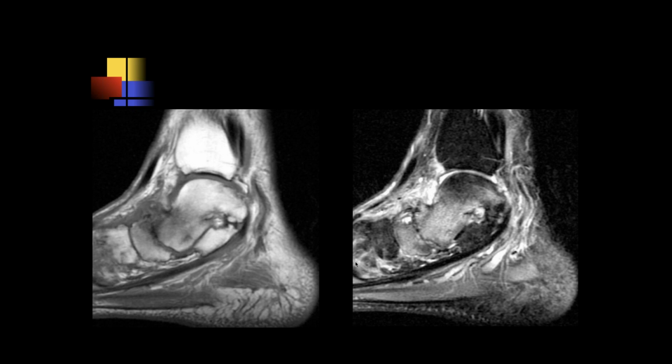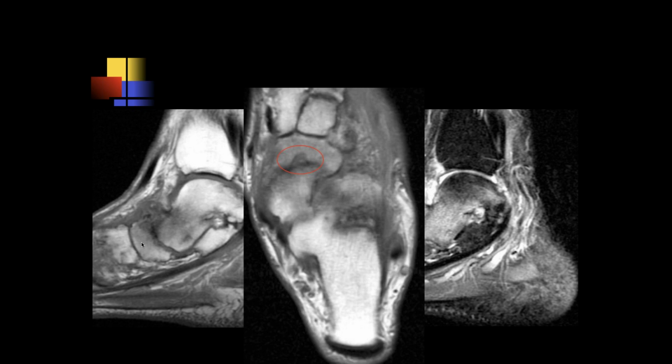It's pretty steep, which you can see in a hindfoot valgus type deformity. Yeah, it's flexed with respect to the other bones here, and there's degenerative disease of the talar-navicular joint, as you said. I would call it a little vertical. Yeah. And then, of course, you do want to look at the PTT integrity. And so I guess we're showing an osteochondral lesion of the navicular.